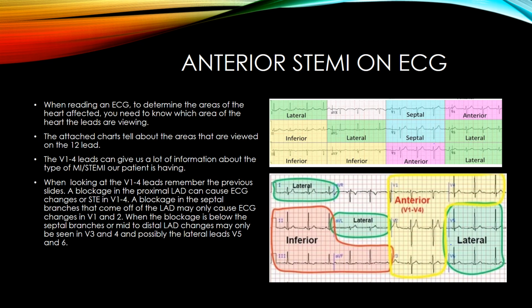Anterior STEMI on a 12 lead. When we're reading an EKG, we want to determine what area of the heart you're looking at, what's being affected. When you look at the charts that I've attached, the 12 lead readings, you can see that these charts kind of give you two different ways to look at it.